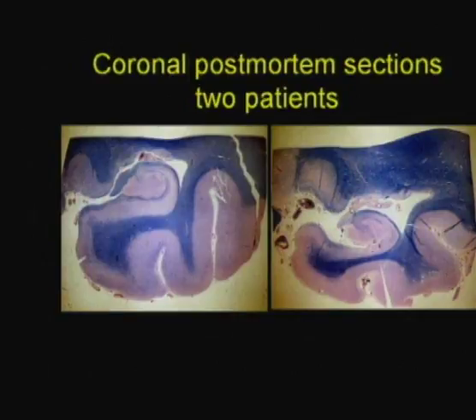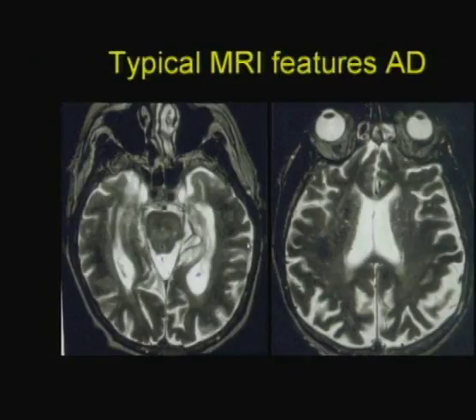And there's two claws, actually, that are formed by the transverse fissure, or the choroidal hippocampal fissure, if you wish. And that's the choroidal and the hippocampal branches or claws that come out of the transverse fissure. So this is what you're going to see. The typical MRI features of Alzheimer's disease are really no different than that original CAT scan that I showed you of that unfortunate patient.